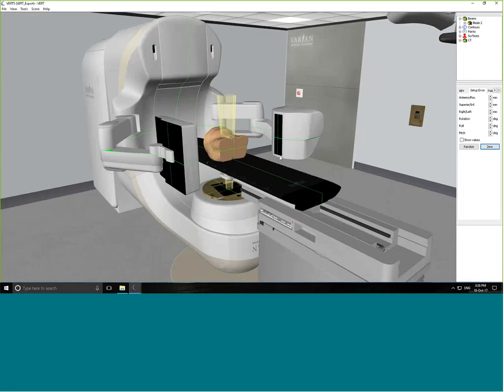So you can see it does everything that you'd want it to do. You can manually put the error in, you can have an automatic error, complete with your acquisition, and then you can do your auto match, your manual match, and use your matching tools in order to match your patient and show that you're in the right place.